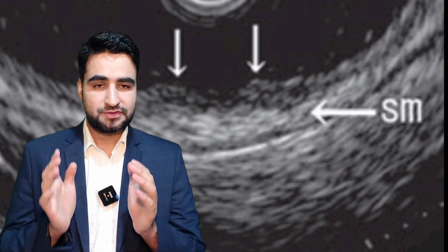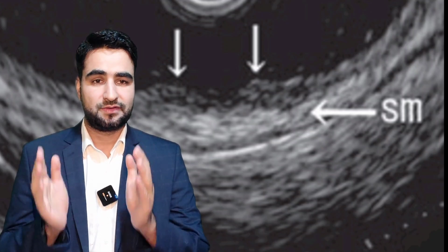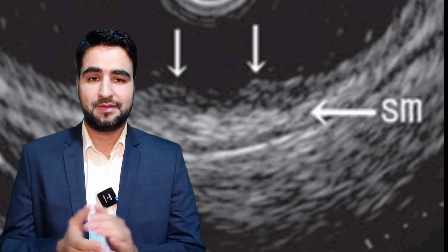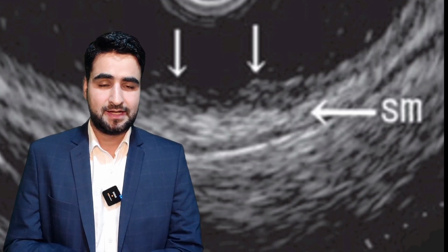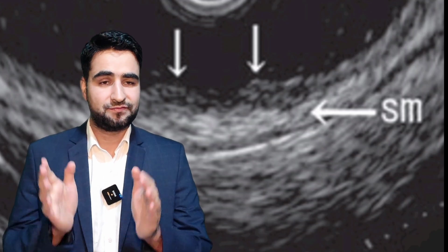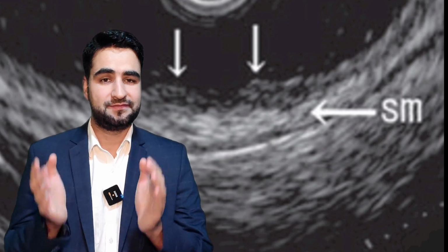So that was today's short endoscopic ultrasound case interpretation: disappearance of the first hyperechoic layer, mild hypoechoic change of the second layer, and a normal third hyperechoic layer. It's a classic pattern of a lesion confined to the mucosa, which can help differentiate early disease from advanced invasion.